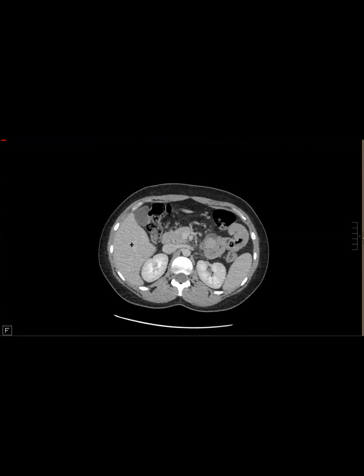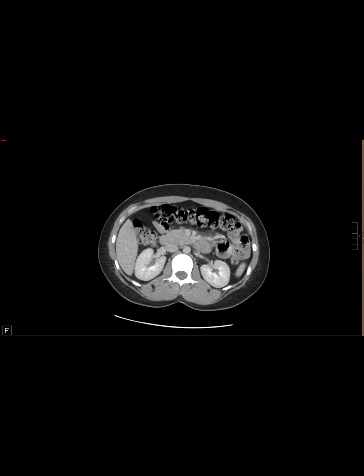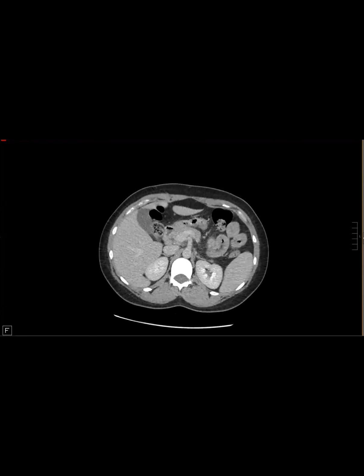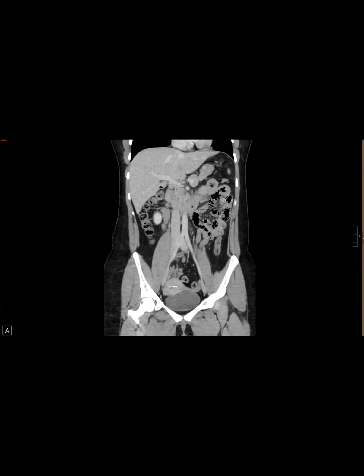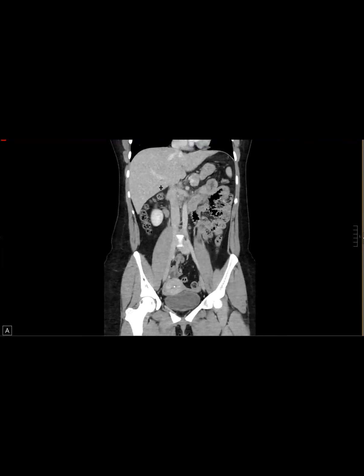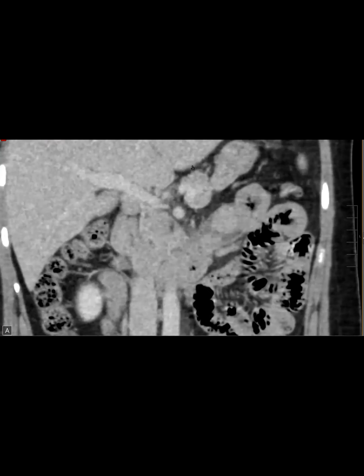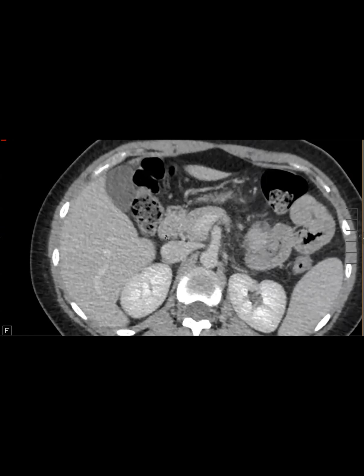So Nelly, this is Kumar. Oh, go ahead, Kumar. So we had a paper published just exactly like this. Really? Yeah, and it would come in the differential, but with all the inflammation around it, I think ectopic pancreas with pancreatitis is your number one. The only thing that might help is if you can see a duct within that, and if you zoom it up, sometimes you see a duct, like in any pancreas, so it'll have a duct.